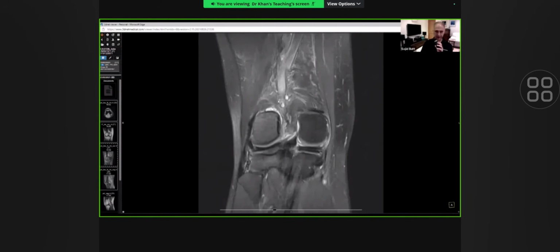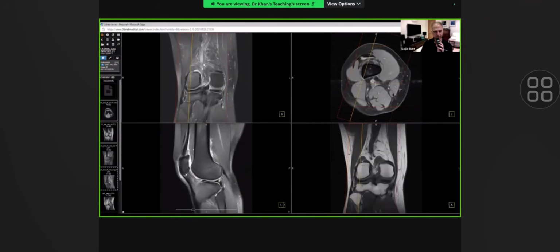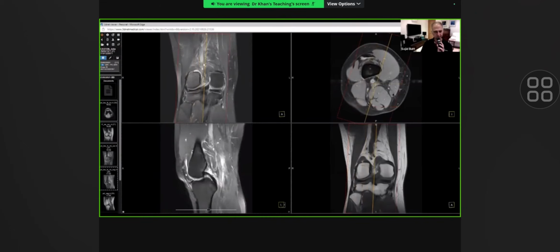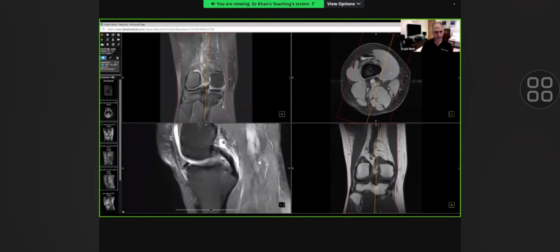Professor Resnick says that this one image is the most important image in knee MR, the one which allows you to see an intact attachment of the posterior root of medial meniscus. And if you can't see that, we'll notice that and then try and see what it looks like on a sagittal imaging. You see here? I'm going to mag it up. There is some knee joint effusion and a loose body.